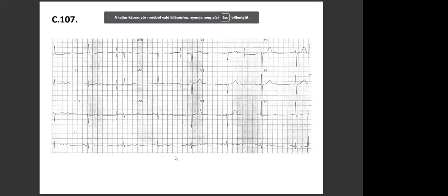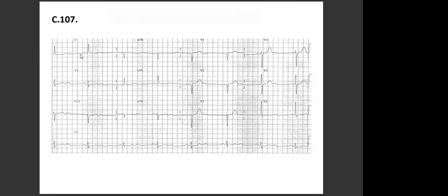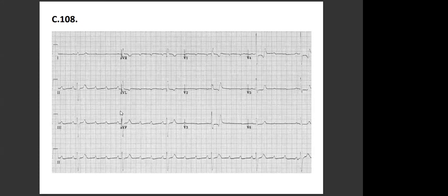But again, we have a problem on these ECGs, as you see here. Axis, as you said, what was the axis? It's normal? Well, it's not normal. No, because lead 1 is positive, AVF is negative. It cannot be normal. That's it. Lead number 2, after you have to look at positive. So it's between 0 and -30. That's a left deviation. Left deviation, okay. Good. Let's see 108.